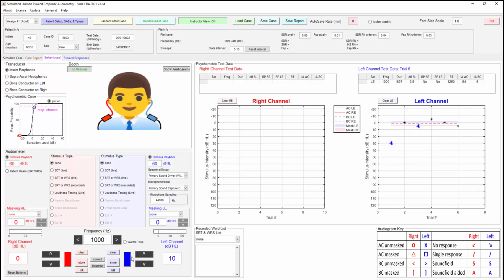no response, up 5. Response, we still don't have 2 out of 3, so we go down 10, response present, and that's not 2 out of 3, so go down 10, no response, up 5, up 5, up 5, we got a response present, and there are 2 out of 3 response present at that.